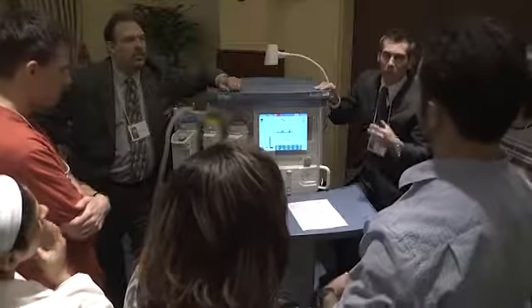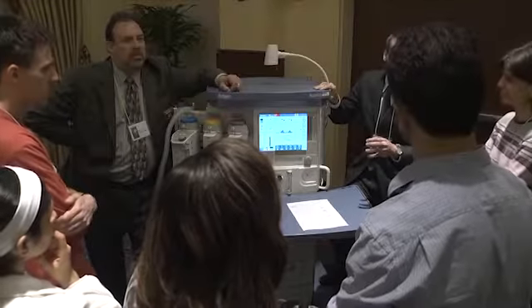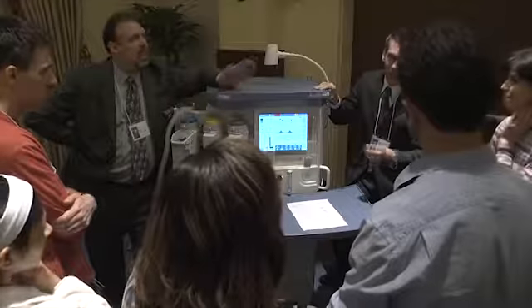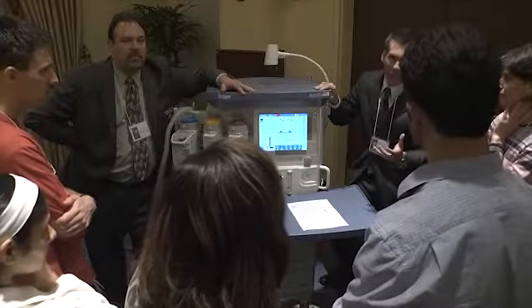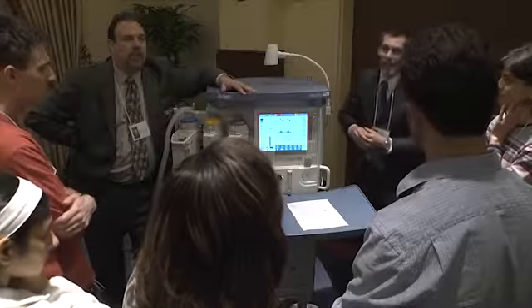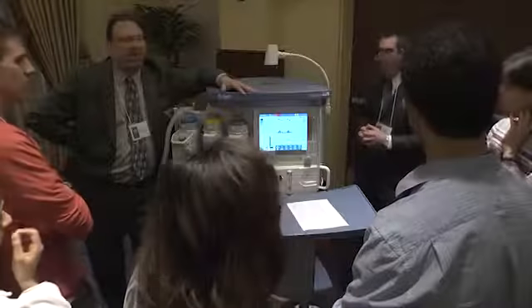So for most people, it's a good habit to use pressure support at some level anyway, because 5 centimeters of water pressure is a little bit more than compensation for the ET tube. So you always feel safe with that. If you just set your pressure support on this initial screen, it automatically turns the sync on. So that's a nice way, I think, on this machine to do that. So we'll move through those calculations.